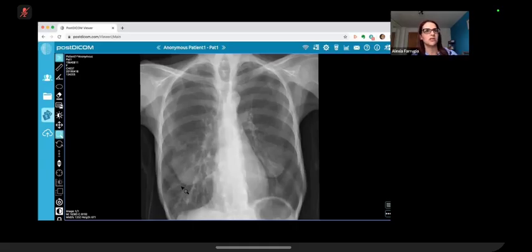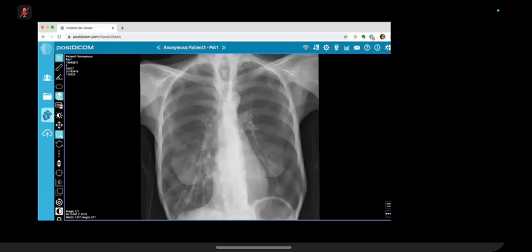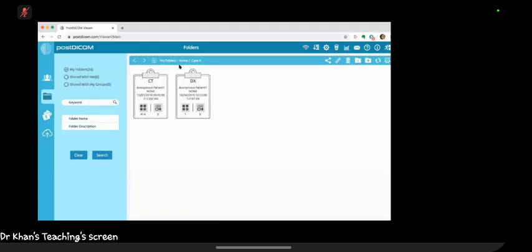Yeah, as you said, the differential diagnosis would include TB, and it would include other causes of bronchiectasis as well. But because of the distribution in middle lobe and lingula, that would favor Lady-Windermere syndrome or Mycobacterium avium complex infection in the appropriate clinical scenario, in this case, an elderly female with pre-existing lung disease. Okay. Great, thank you. You're welcome.